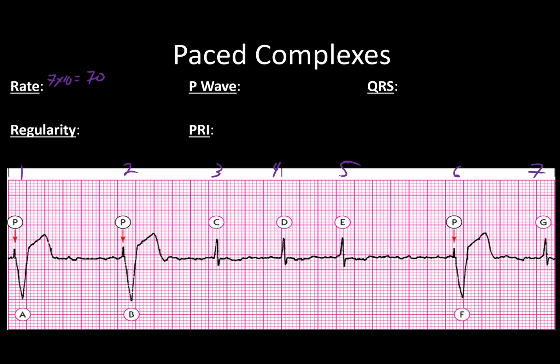It is irregular for sure. There's no pattern to it per se, but we do have paced and native beats.